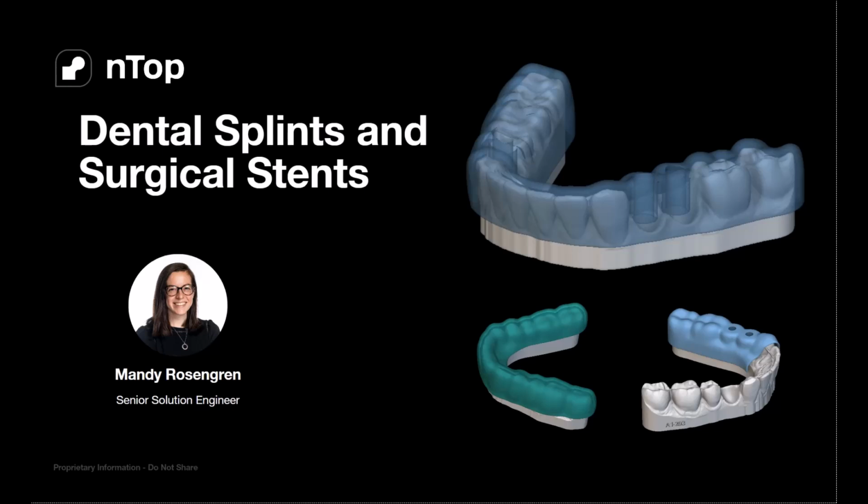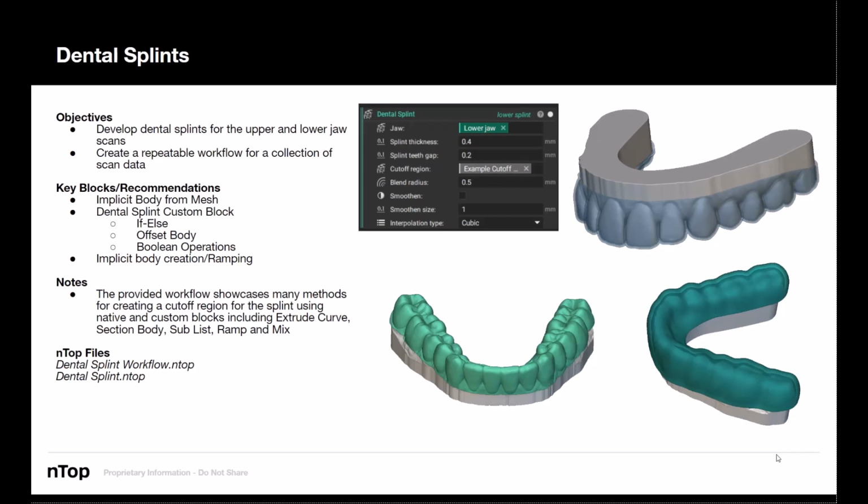I'm a Senior Solution Engineer here at NTOP, and today I will go through how we can generate dental splints and surgical stents within NTOP. So the first thing that we will do is go from scratch in an NTOP file and use our teeth scan to create our dental splints.